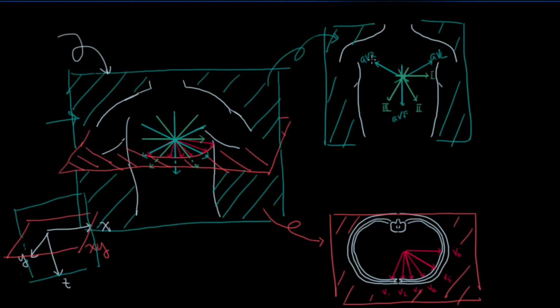So at this point, I would really imagine that looking at all of these things at once is very overwhelming, right? So we're going to just try to focus down into one of the leads. So if you think of your typical heart like we have here, for example, where you have your right atrium, left atrium, right ventricle, left ventricle, the electrical signal tends to start up here, SA node, AV node, and of course it goes into various places and then comes back here.